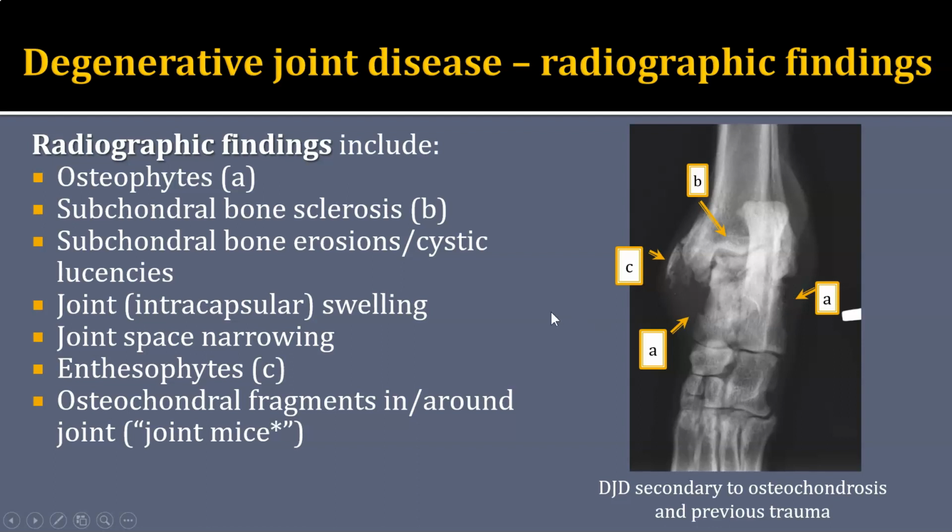We may be able to identify that the subchondral bone is thicker than it should be from sclerosis. And remember, sclerosis is increased bone opacity that happens within the bone. Okay, so periosteal reactions on the outside cortex and sclerosis on the inside. So in this patient, we see some increased bone opacity here, where that subchondral bone should just be a thin layer of opaque bone. So for example, on this base of this calcaneus, this thin region of bone would be our normal subchondral bone.